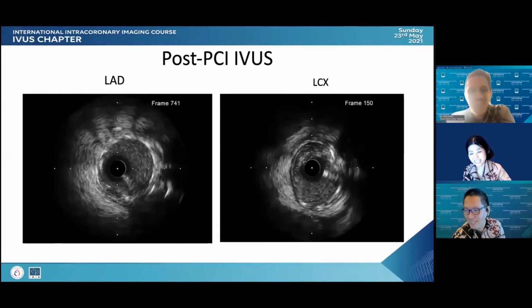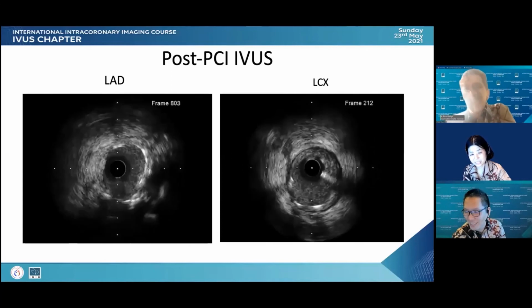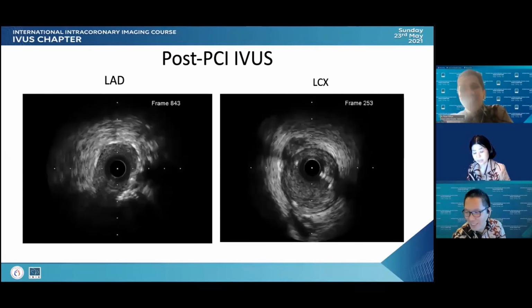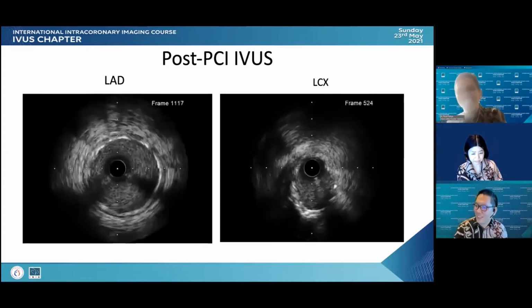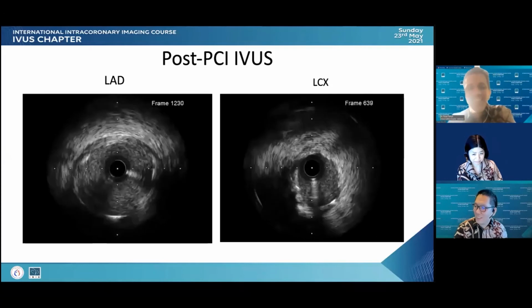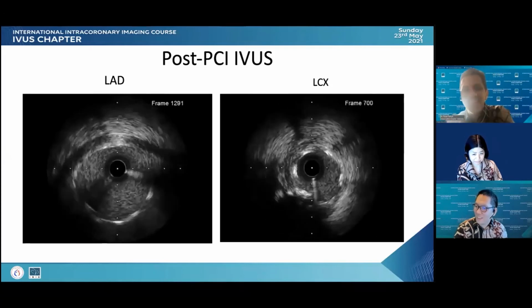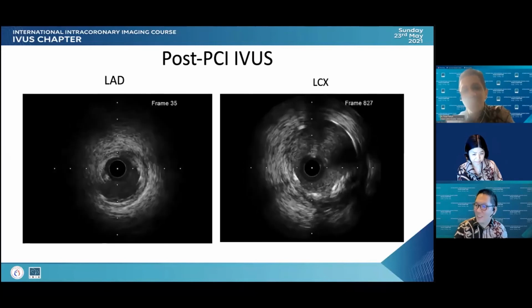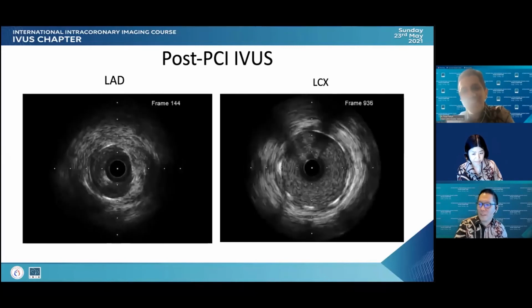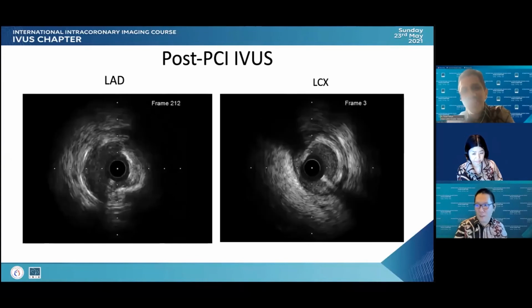Let the panelists reveal. So it's a little bit difficult, IVUS. This kind of quiz, how the IVUS reveals the circumflex. I know it looks like you got it.